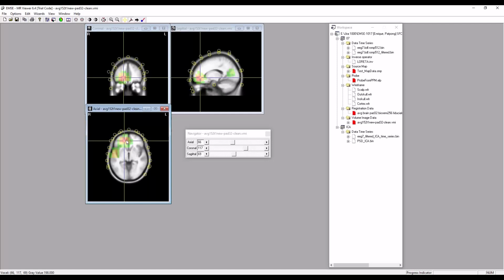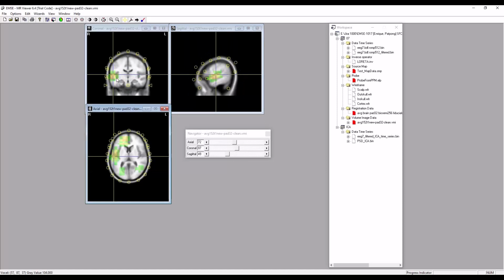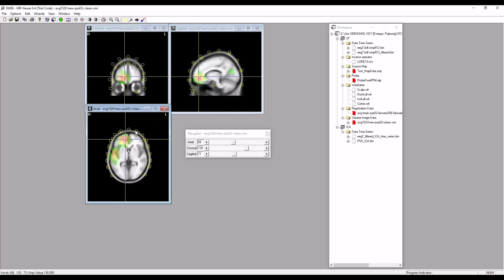And of course you have to know where it came from. And there are many, many choices. Here looks like maybe that's close to posterior cingulate, for what that may be worth. Notice this is radiological convention, showing as a radiologist would see it, mirror image flipped. So this is really on the right side, and it looks like it could potentially be auditory cortex. This frontal lobe is also on the right side.